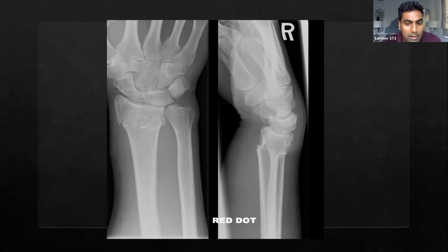If in the OSCE you're not sure about the fracture, you want to have a bit of time to think about it. Your approach was absolutely fine as well, just to buy yourself some thinking time, because the way you did it, it came across completely fine. So I'm happy with either approach. The only thing I would change is maybe describe the pattern of the fracture first of all.